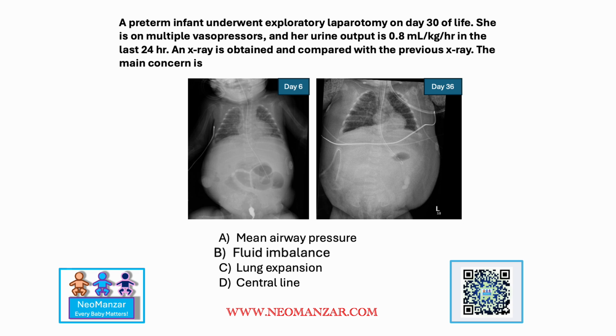Zoom the picture. Okay, the correct choice here is fluid imbalance. So what you see here is most evident or worrisome. Let me show it to you. Look at this skin thickness. There's so much fluid collection in the skin. I don't know if you can appreciate it, but see the bilateral fluid here. Here, if you compare, you barely see any fluid outside the chest wall. And also here, look at the ballooning of the abdomen. So it's edema and a lot of fluid collection. So it has to be some fluid imbalance.